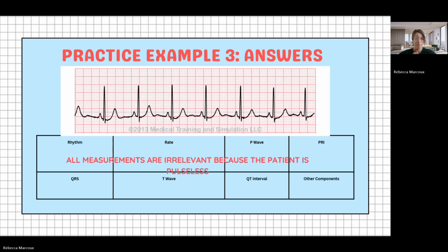So the biggest takeaway I want you to have here is the rhythm is irrelevant at this point. It's not VF or VTAC, and the patient's pulseless. So we need to start CPR. It does not matter what these measurements are.